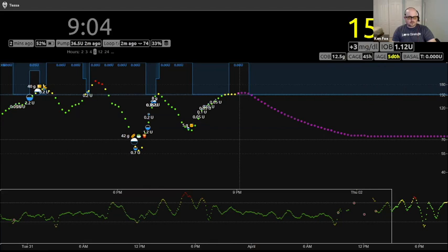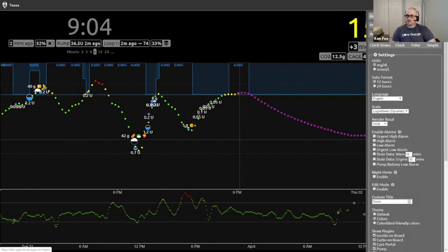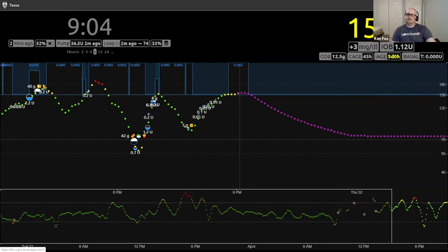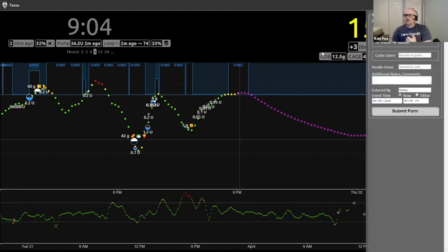Admin profile reports and show plugins. All right, so let's cover Care Portal. So I showed you where the reports are. We'll go over them in a minute. The Care Portal, that's one of the show plugins here. That's recommended to be turned on, Care Portal. It adds this little plus at the top right. You have to be logged in to use it. So you have to have your API secret entered.